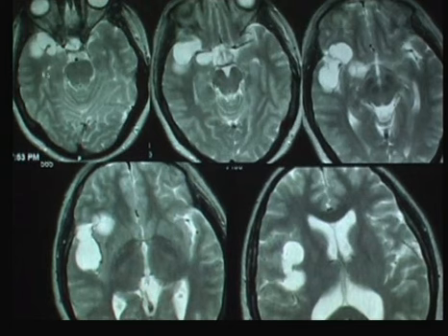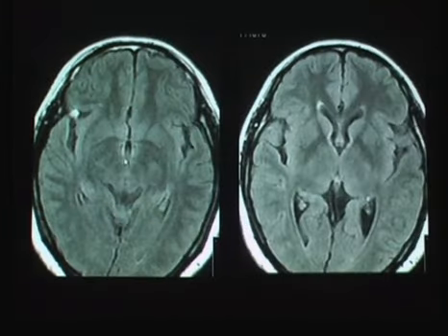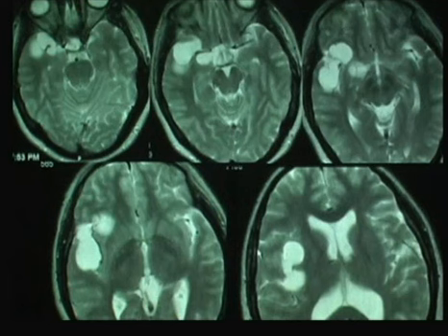But again, one thing that's interesting with these subarachnoid lesions is that we actually won't see the scolex in these lesions for whatever reason. When we went back to this patient's neuroimaging, because they came to our institution several times, we noticed that just a little bit beforehand, there was some asymmetric distension of that right Sylvian fissure. And when we went even further back, when the patient first came to us, there was a small lesion seen here at the Sylvian fissure. And so the question was, is this something that eventually developed into this?